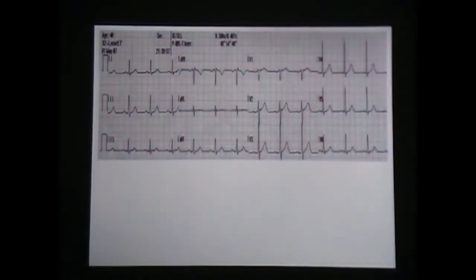So initial suspicion, just based on the history, I'm thinking infectious source of some sort. He's got the temperature, he's got the cough, plus the pain. With the way that he's describing the pain, sharp and non-radiating, I would think we've got a potential for pericarditis. It would be odd to see, but he's definitely got potential. As far as the EKG is concerned, remember to use those systematic steps. Here's a cheat sheet for you. Run through it.